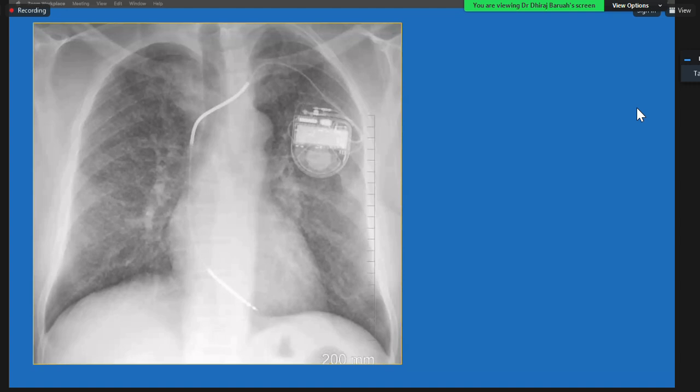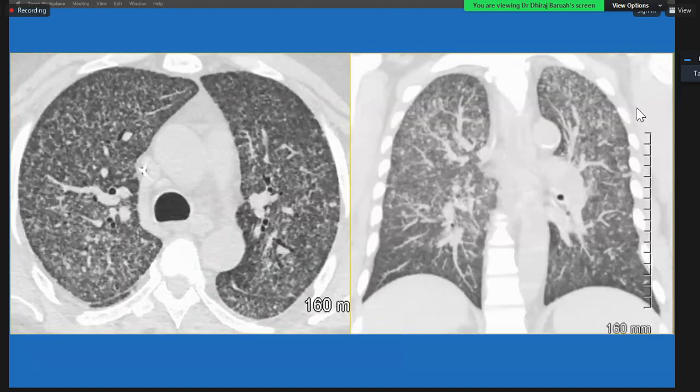Then comes the nodules. So how do you characterize the nodule? When you have discrete nodules like that, multiple tiny, not in specific lung zones, distributed everywhere on the chest radiograph, and they are not coalescing, because when they are alveolar they will try to coalesce and form consolidation, but when they are discrete like that, they are probably interstitial and they are miliary. You probably see a lot of miliary nodules in India. In this case, this was a case of blastomycosis.